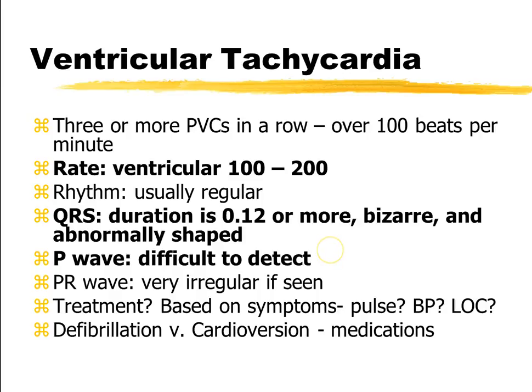So again, what's going on with this person? This is not a heart rate pattern that can sustain perfusion. The blood pressure is going to go down, and there's not a good cardiac output happening. So we're going to look at the person and decide how we are going to treat them. If they are not conscious, they look terrible, we can defibrillate this person.